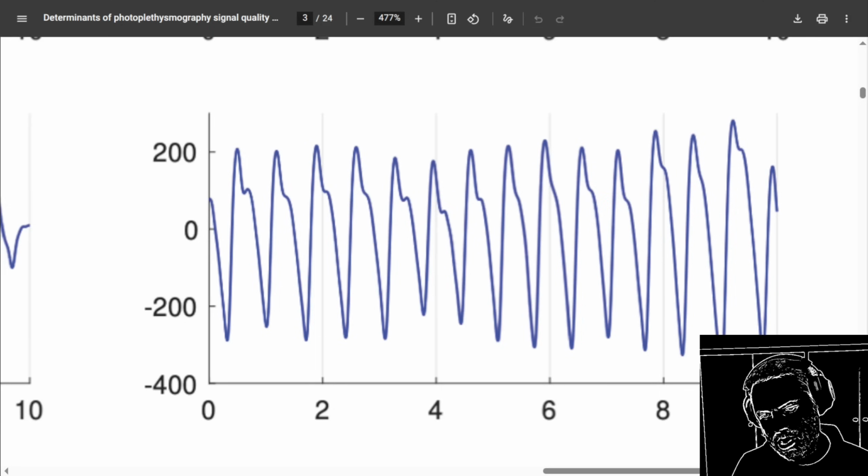My apologies, you are correct. Upon closer inspection, the peak at second 4 appears to have a more prominent dicrotic notch compared to the peak at second 6. This suggests that the signal quality at second 4 may be better for discerning this specific feature, providing clearer information about arterial health. Thank you for correcting me.